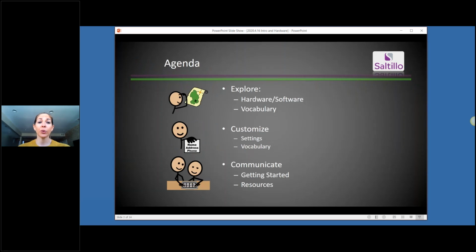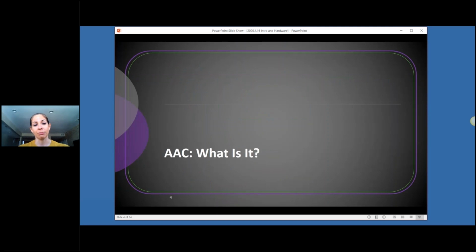home. I've created a couple of segments of recordings that are going to cover the following topics. It could explore the NovaChat hardware and software and the vocabulary files, talking about customizing the settings of the NovaChat and customizing the vocabulary file, and then focusing on communication, why and how we actually use the communication system. For today's training, we are going to specifically look at the top bullet point, exploring the hardware and software, and just exploring a little bit of the vocabulary file.